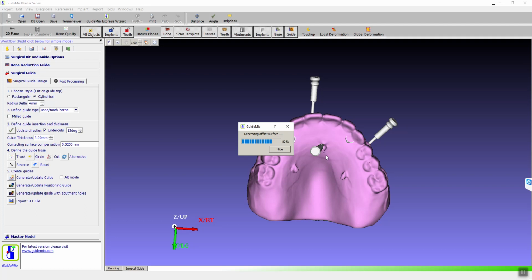For sure, if you place 8 implants, there is going to be no teeth remaining on the surgical guide. So everything will be cut away. In that case, you have no way to guarantee the surgical guide will fit onto the patient's mouth as it should, because the tissue is flat, the guide can tilt, can shift to the left and right.